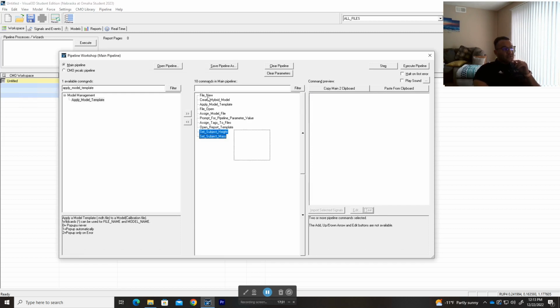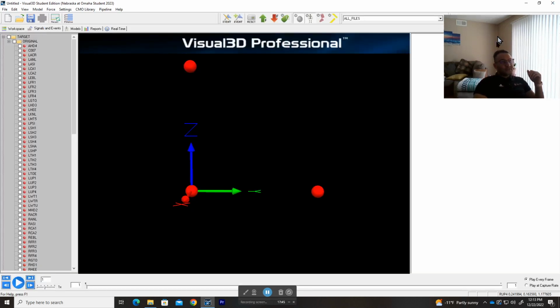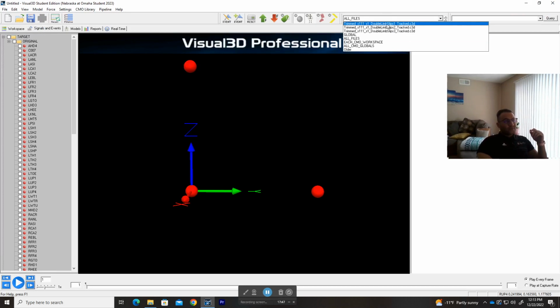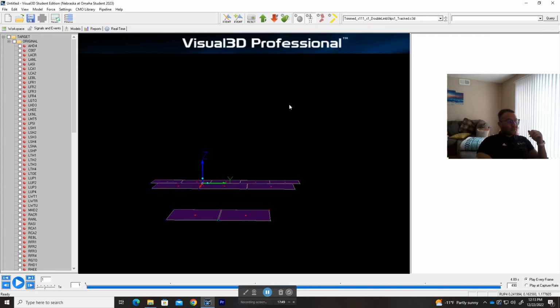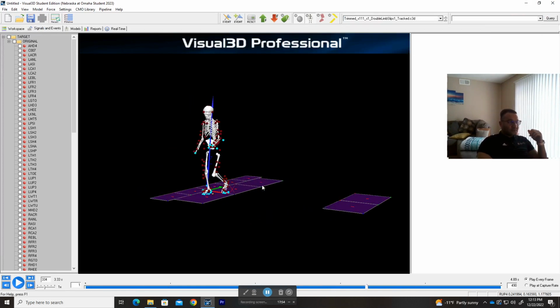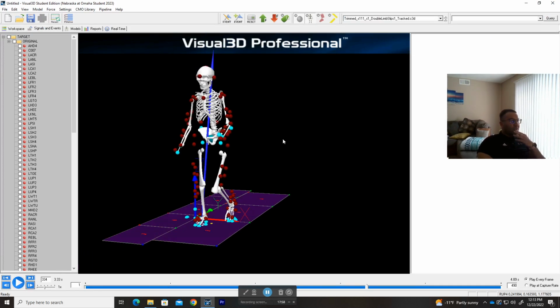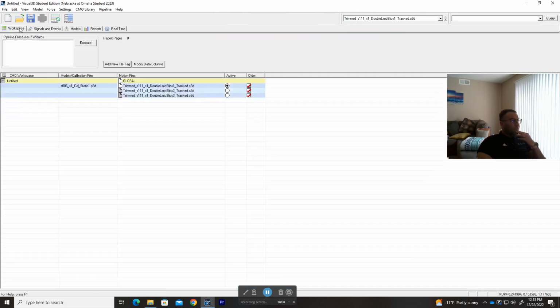Alright, so once you finish the pipeline, for example, when I close this, you see right now it's the same as it was because I ran the same pipeline. When we go to signals and events, you'll see here there's all files. We can choose any specific file and boom, it works. But if you notice here, I believe I chose the wrong model.